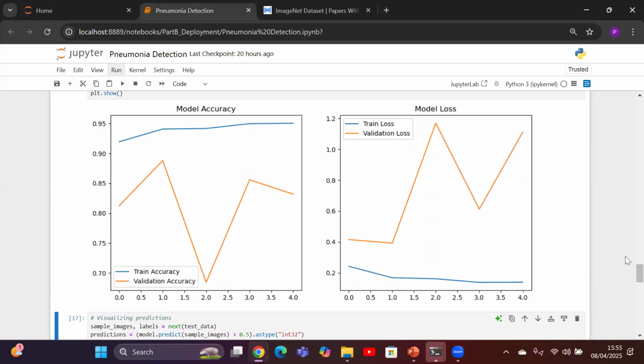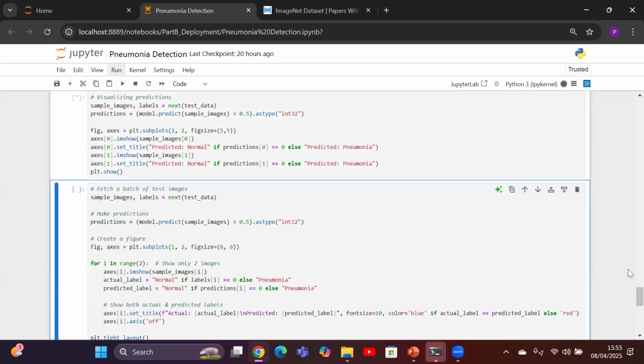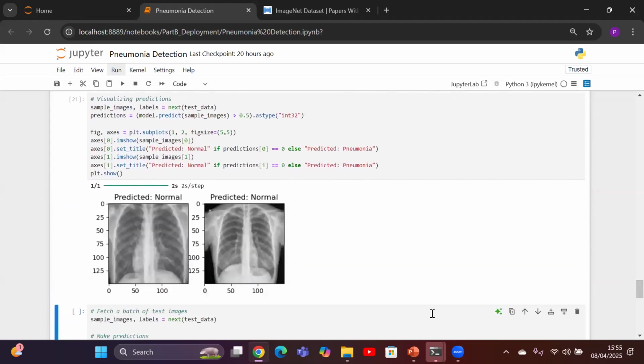However, it all depends upon the data and upon your fine tuning. How well the model performs on new or unseen data is very important, to ensure it is truly learning and not just memorizing. So I just wanted to understand how this particular model behaves with new data. I have given two images, like a subplot.